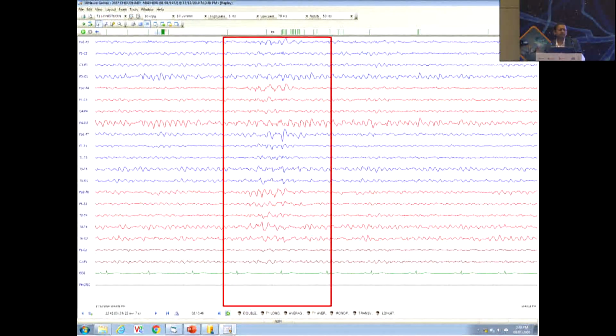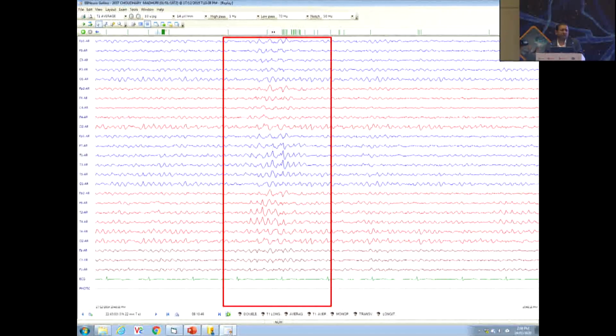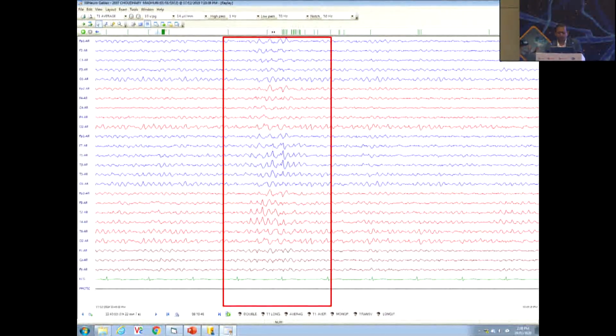Most of these benign variants are not very well seen in bipolar montage. They are better seen in the referential montage. You can see a sharp activity here occurring in train. So these are wicket waves which may mimic temporal spikes. So differentiating points: one, amplitude is less; two, it doesn't disturb the ongoing background activity; it will appear only in drowsiness, and the location is fixed, it will be only in the temporal region.